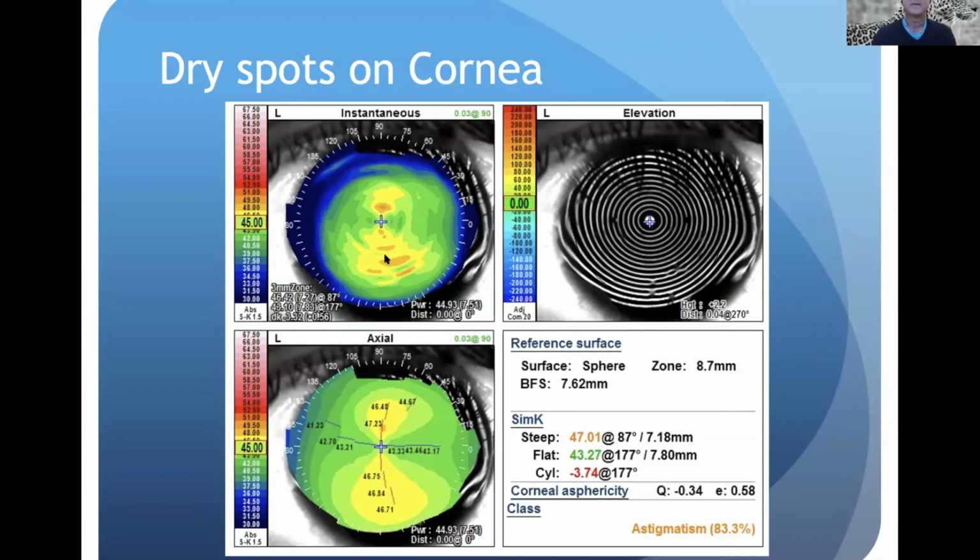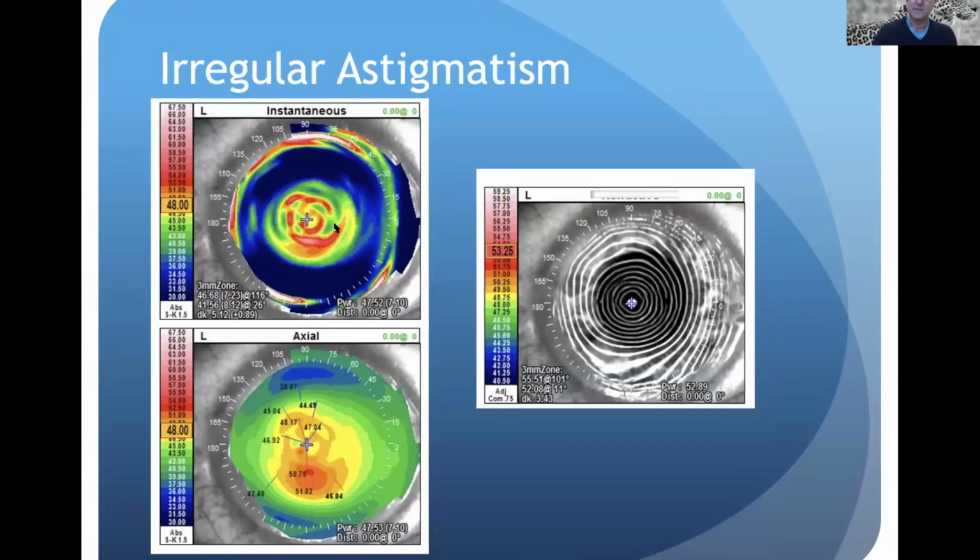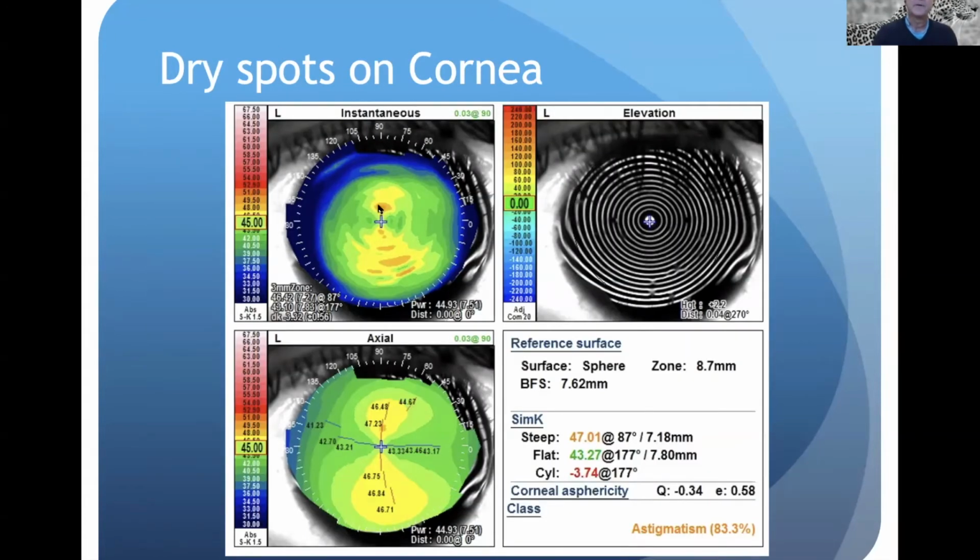The truth is that there's very little in a smooth cornea that's going to give you islands of steepness, so to speak. It's not really steepness, it's change in curvature. And a lot of that disappears when we look at it on the axial representation. So by changing the algorithm, we smooth out, get rid of some of the noise.